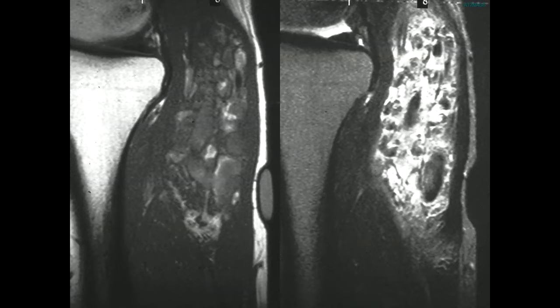This is a case where history was incredibly important. This patient came in for evaluation of a painful mass in the popliteal fossa. The mass had become painful while he was flying back from New Zealand to the United States on a business trip. And when you spoke to the patient, he said when he was 15 years old, his family physician had told him he had a hemangioma behind the knee, that it was nothing to worry about and he should leave it alone.